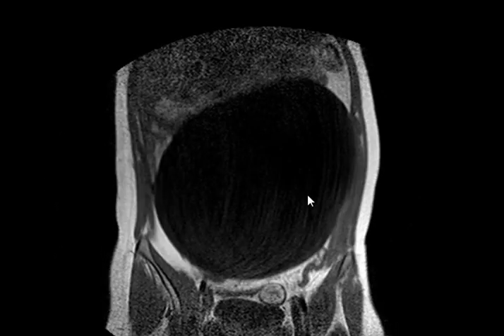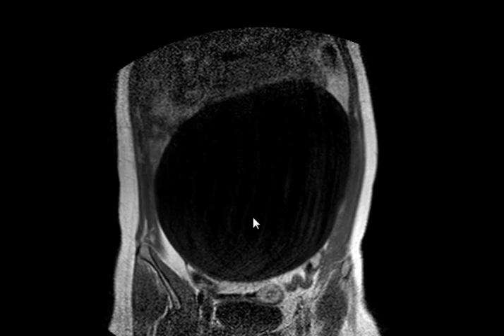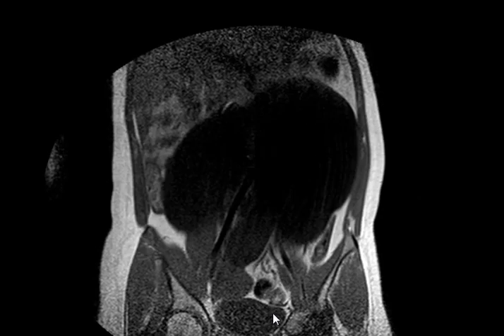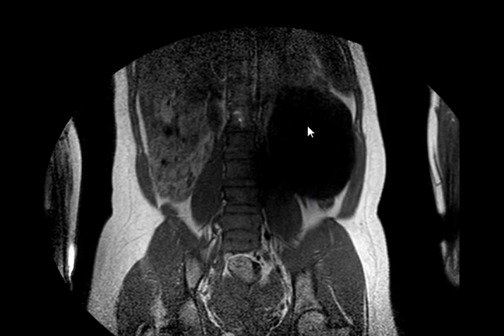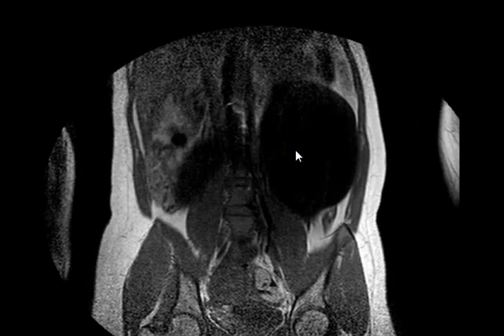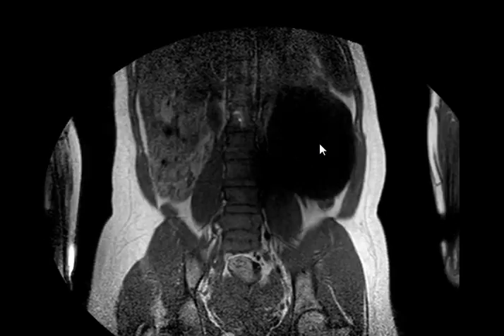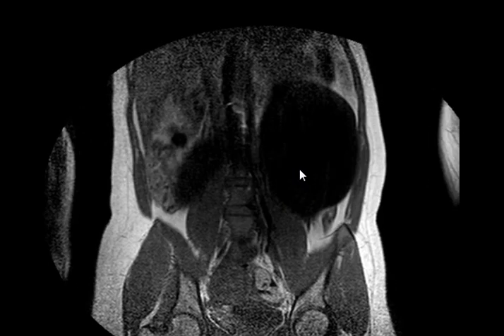Also the same thing. There's the hypointense mass, a cystic lesion, well defined, located at the anterior abdominal wall or intra-abdominal. Intra-abdominal, not anterior abdominal wall. It's extending from the left kidney, I think. Wait, what is the origin of the lesion? From where is it arising? This is the question. That will solve the whole thing.